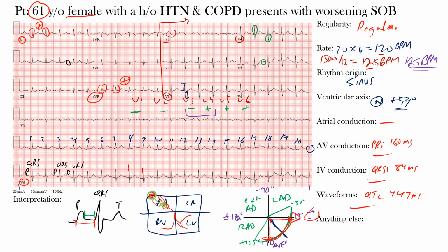Now, one thing I want you to keep in mind with the transitional zone, like R wave progression, is that it is highly dependent on lead placement, which is, again, an imperfect science. So in general, we'll say we have normal R wave progression, okay? Maybe you can say this is slightly abnormal in V1, but generally, let's say it's normal in this case, as well as the transitional zone, okay? Not something to be too concerned with, because otherwise we have a pretty normal EKG, okay?